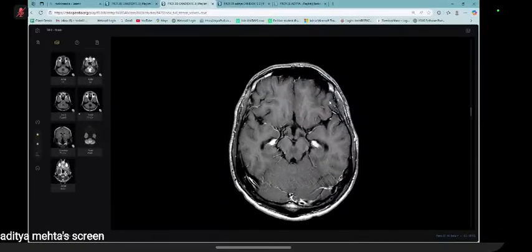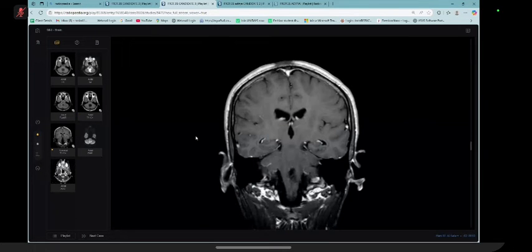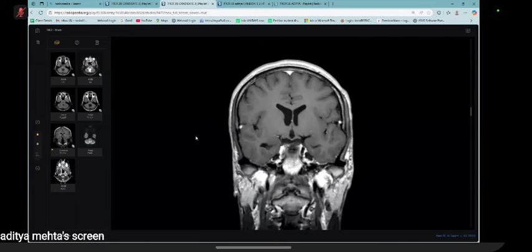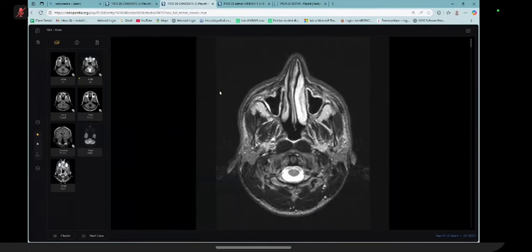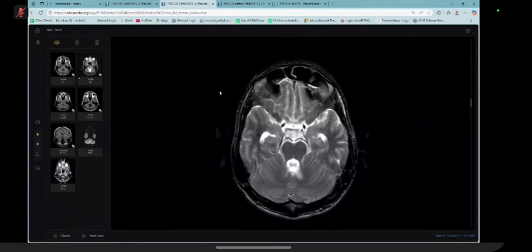In my routine practice I will also look for it in the sagittal view, just to see why the patient has cervical pain. We have coronal instead. Okay, I believe it's extending downward to the spinal canal of the neck. We're not sure about it, but there may be CSF pressure issues, which may cause the pain. But this is an emergency.